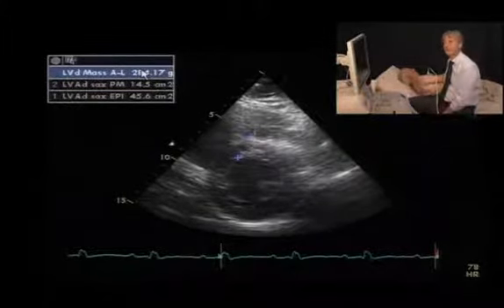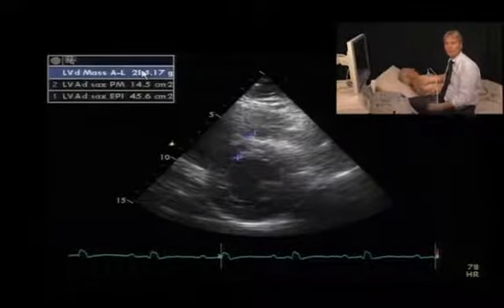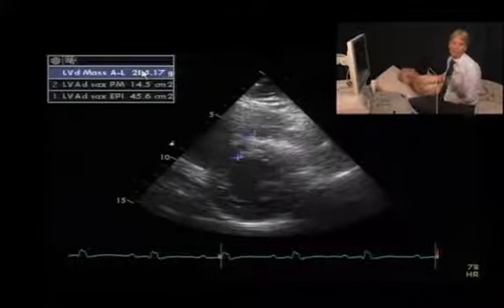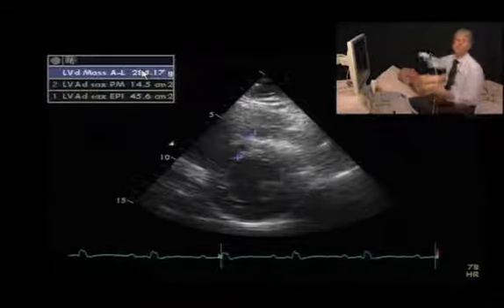You could then perform the same measurement also in systole with the end systolic length of the left ventricle. These two measurements, however, should at least moderately agree.